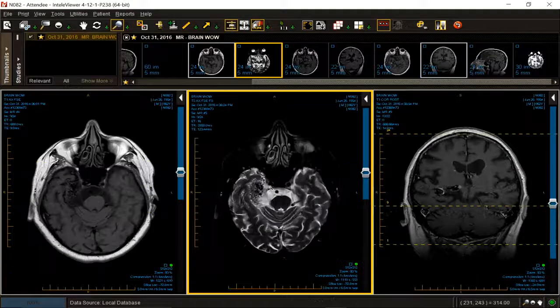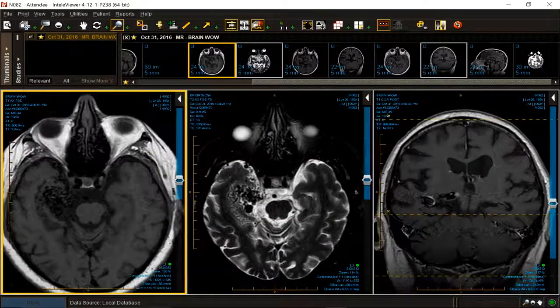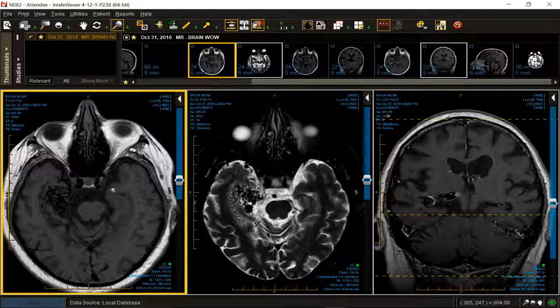Patient is 62 years of age. Now, why am I giving you so much extra time for something so obvious? Because I want you to be thinking about drainage, supply, eloquent brain. What areas are involved? Now let's discuss.